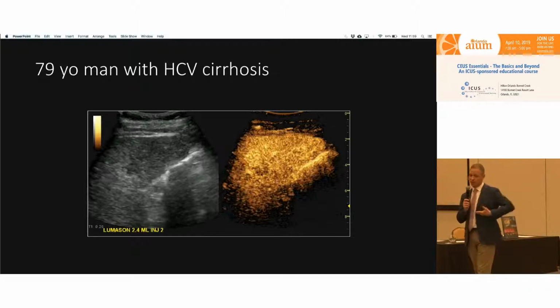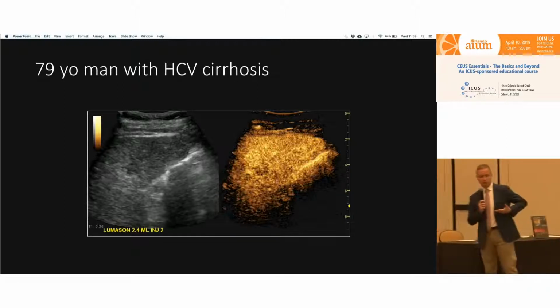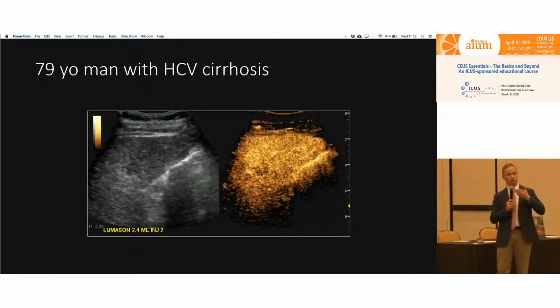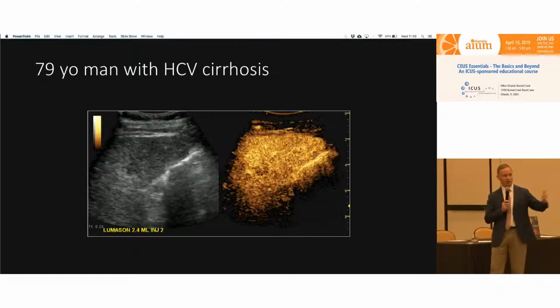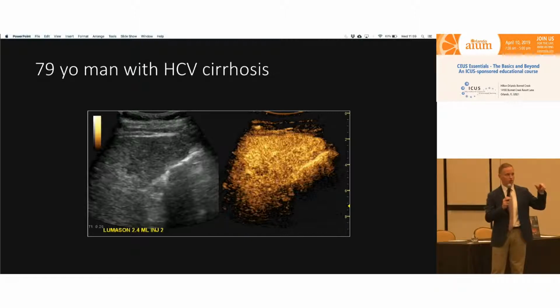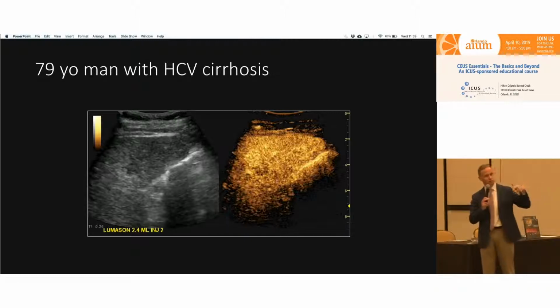Quite often people scan perpendicular to the liver, going by intercostal spaces, and then you're going to see your tumor getting in and out, in and out of the field of view, and you might miss important things. So even though you might end up with some shadowing along the edges of your screen, I strongly recommend scanning, or at least starting scanning, in the sagittal plane.